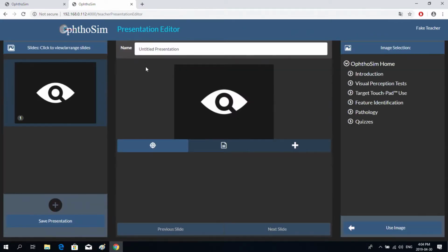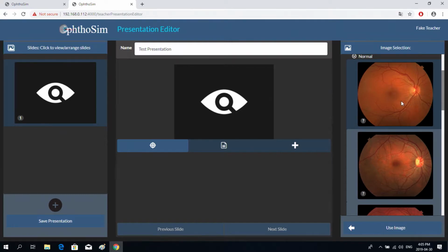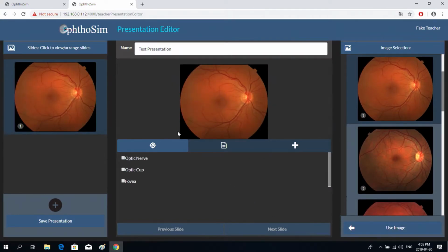So this screen will pop up. Let's call it test presentation. Okay, I'm going to choose my slides for that. So let's use, in the content, let's use a normal eye. So let's use this normal eye. So we'll use that image.